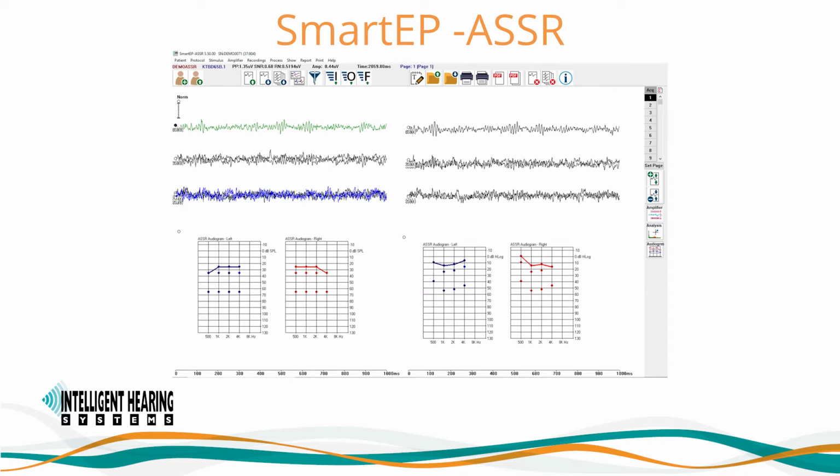Hello, and welcome to this training session for SmartEP-ASSR Auditory Steady State Responses by Intelligent Hearing Systems. Today, I will walk you through the software operation and analysis for ASSR testing. ASSR offers an objective test measure that provides frequency-specific threshold information.